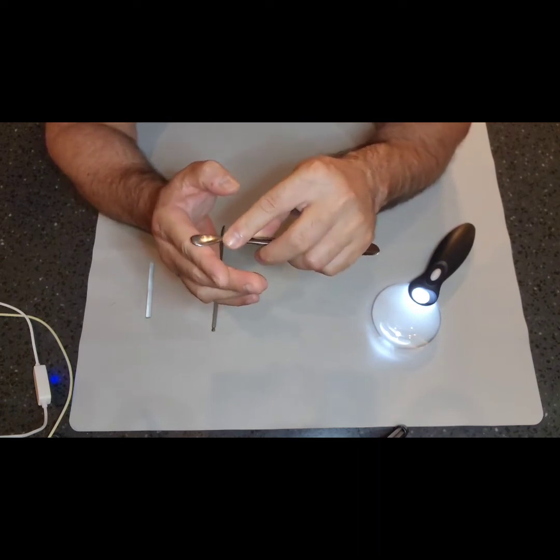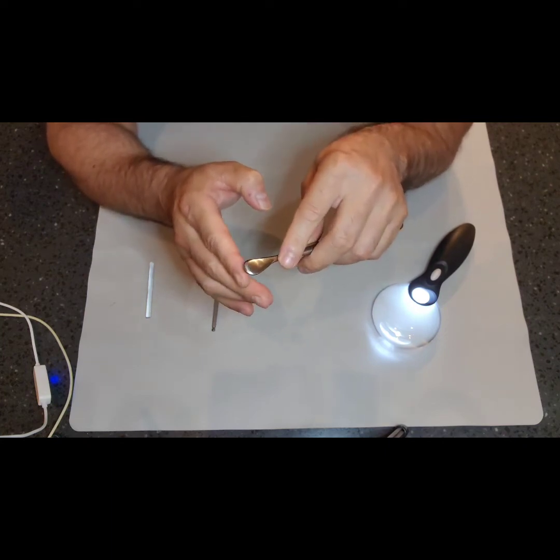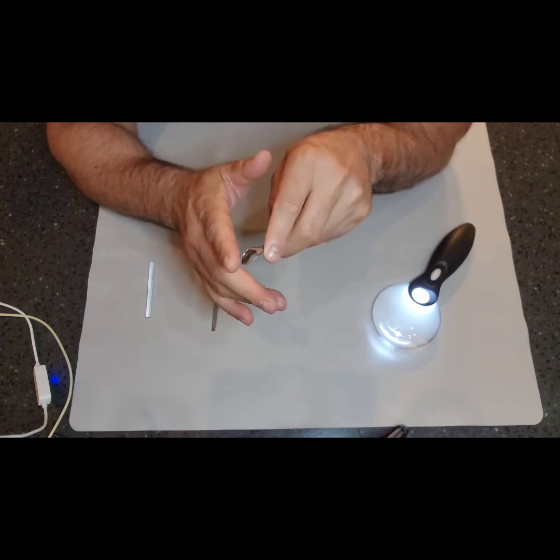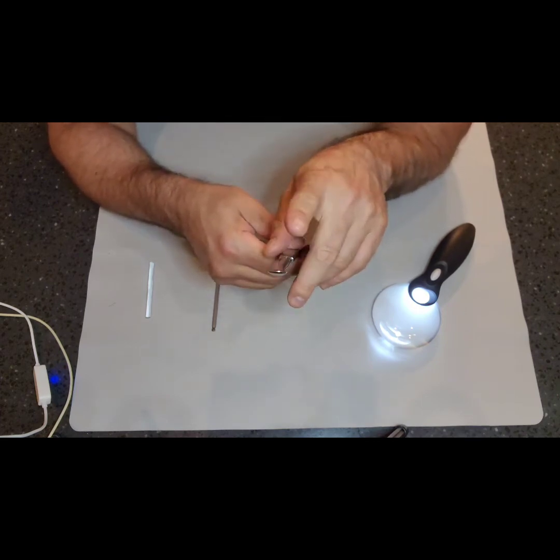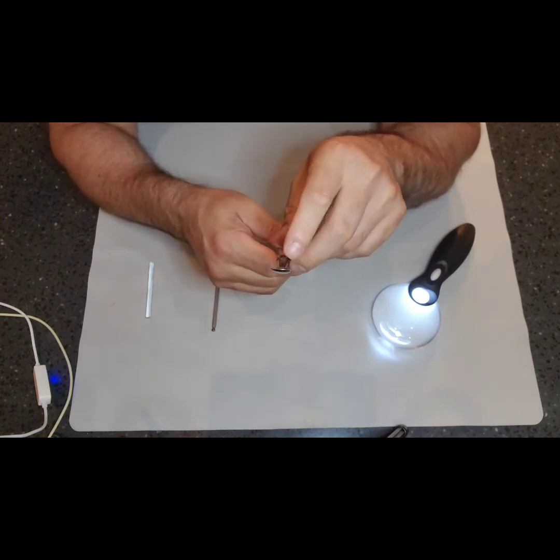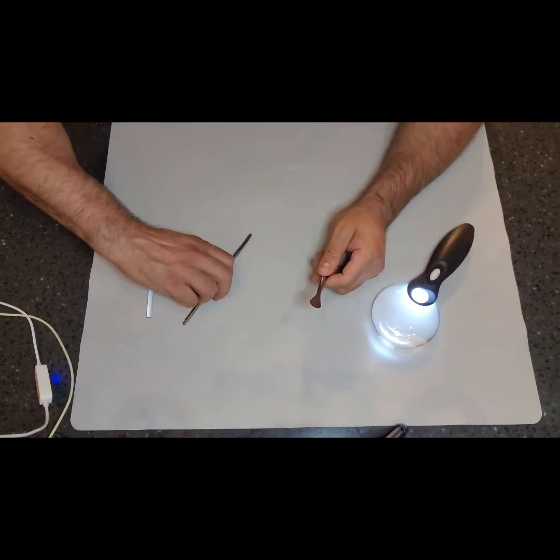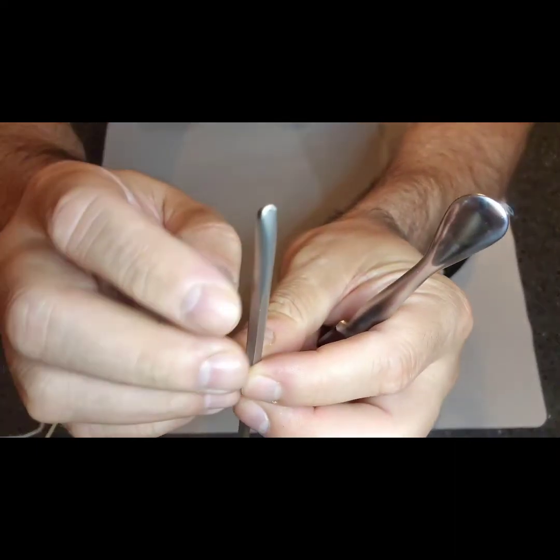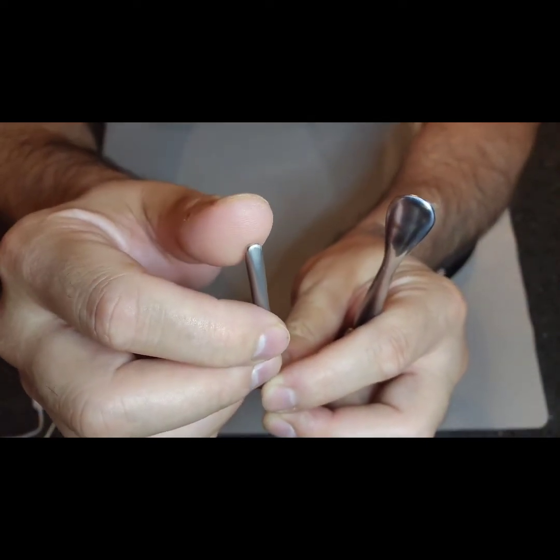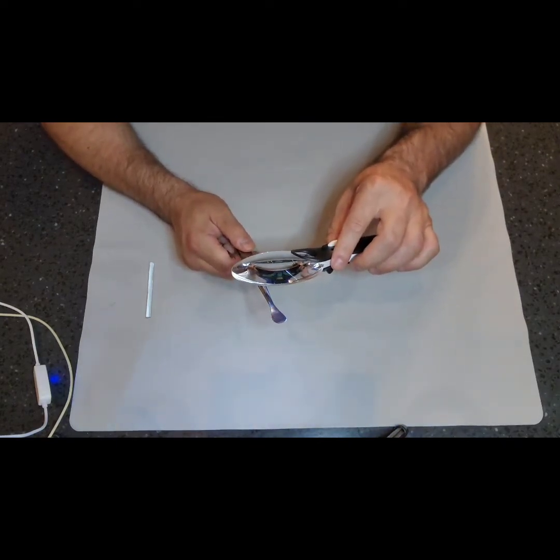Okay, it's used to dissect, so it's gonna actually get under a skin or lift up that periosteum or that tough skin off the bone. So it has to be pretty sharp. Okay, so you want to make sure that there's no dings in it, no kind of bending or excessive damage around that smooth edge. Okay, same thing with this one. You want to make sure it's nice and smoothed out. But if you feel it, it's pretty sharp. All right, so you want to get that magnifier on there and look at it really good.